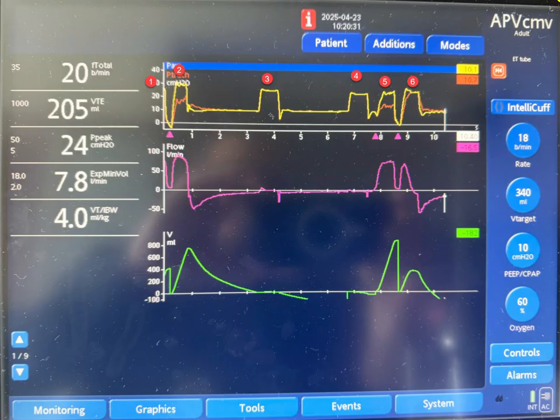So the patient was obstructing this mandatory breath. Now notice what happened after this breath ended. The patient continued to exhale. So actually we have 1200 ml here, he exhaled 800 here, and now he continued to exhale. It goes down. If you continue this, of course you don't see it on the screen, but it should have gone down to -400, where we can exhale all the tidal volume. However, what happened here, there's another straight line indicating that there is a recalibration, and that means that expiration ended, next breath started, and that is another 3.3 seconds.